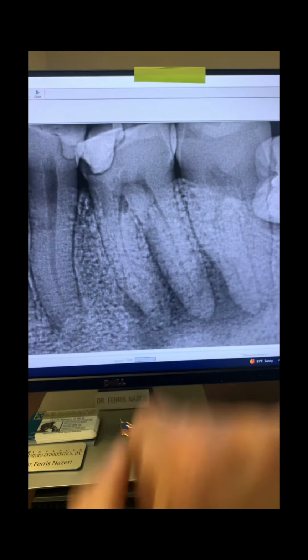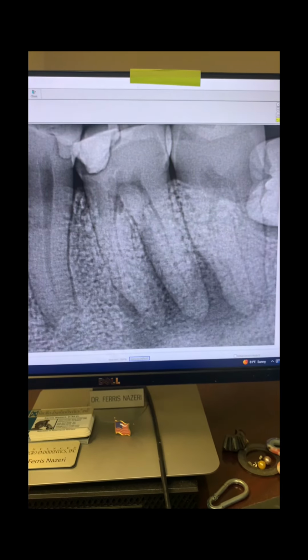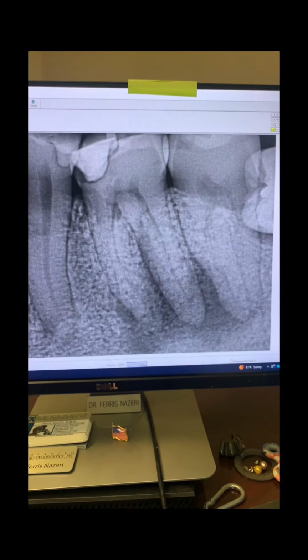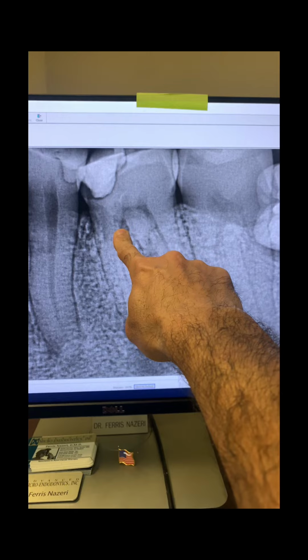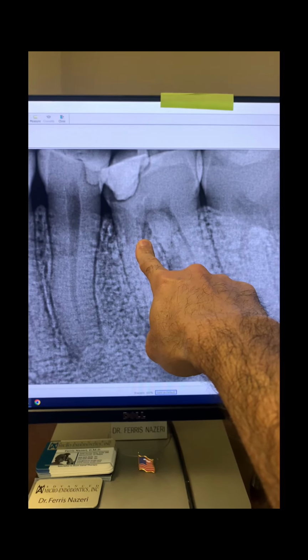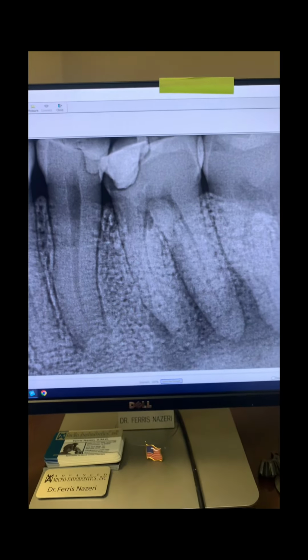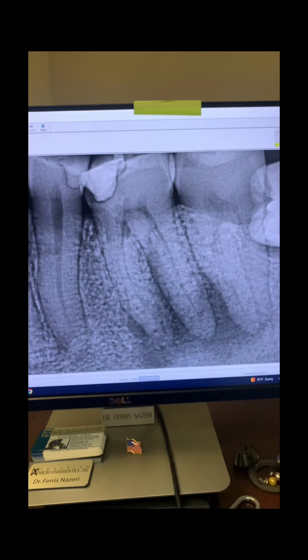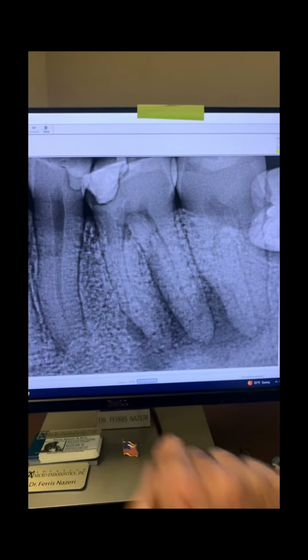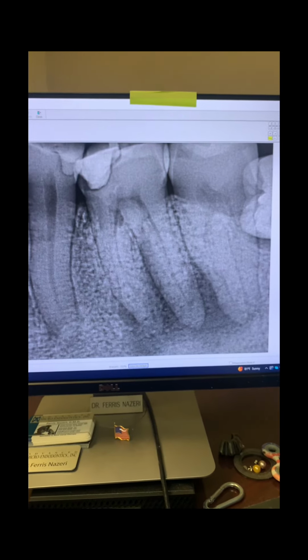All right. This is inflammatory root resorption, and it was about 3 millimeters inferior into the mesiobuccal canal, on the mesial wall of the mesiobuccal canal. It had actually created a perforation, this inflammatory root resorption right there. So that's why it's important to be able to read radiographs.